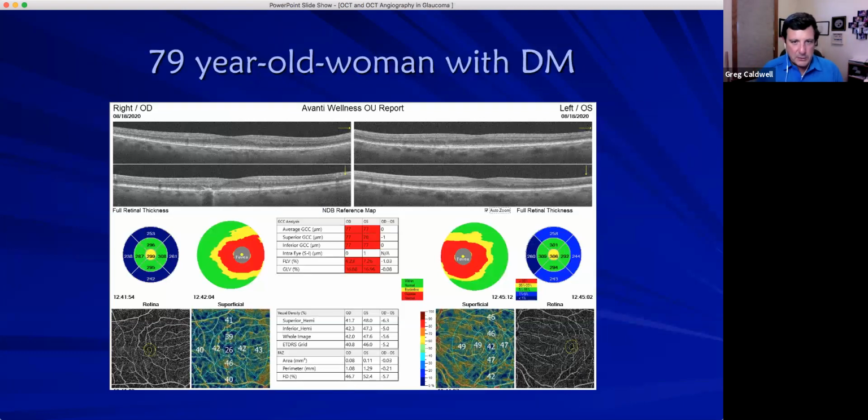Here's just another patient that comes in with diabetes. They do have a little scar right here going on in their retina, but look how thin these are. 77, 77, 77, 77, 77, and this little outlier right here at 78, 0, 1, and 0, 0, 1. Look how symmetric, yellow rim here, little red bullseye, red bullseye. And you can just see how it all translates.